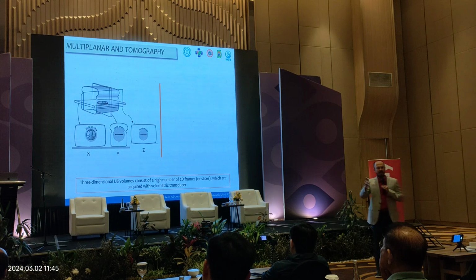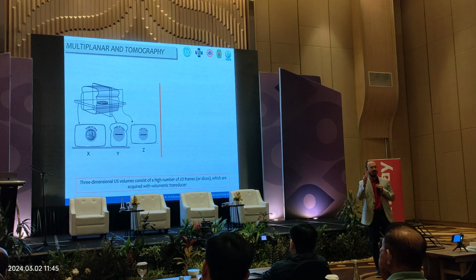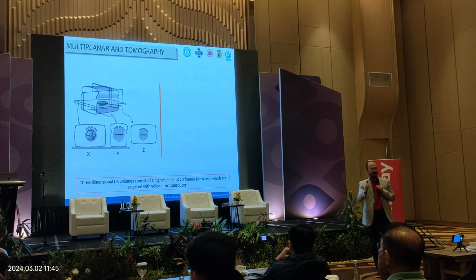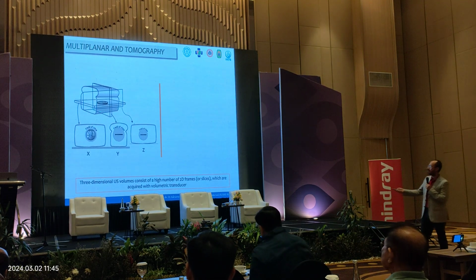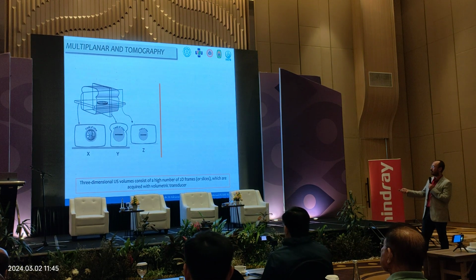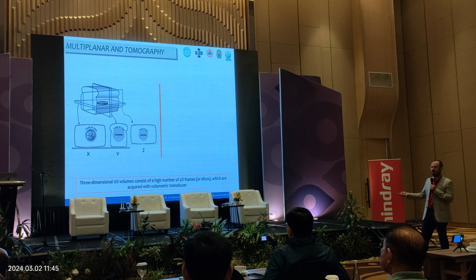So plane A, plane B, and plane C represent the three-dimensional planes X, Y, and Z. If you see a coin inside the bread and you slice it in X, Y, and Z, it looks like what we are showing in front.